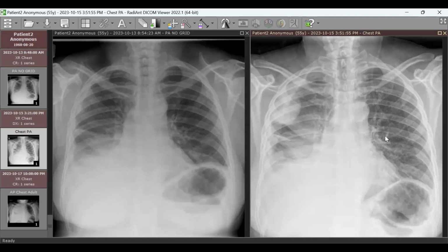Bilateral lines, a CV line, the patient referred to ICU. Just be careful, think about it slowly. Where is it coming from and where is it going? I think it's oxygen tubing.